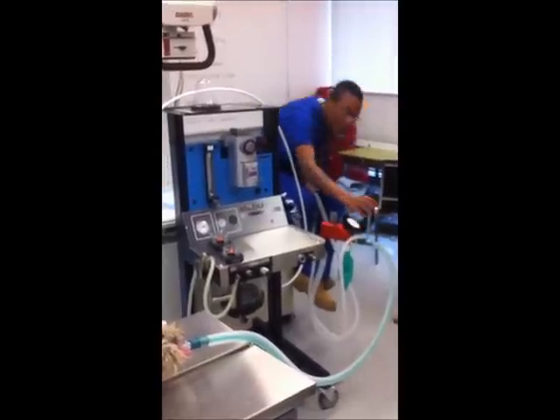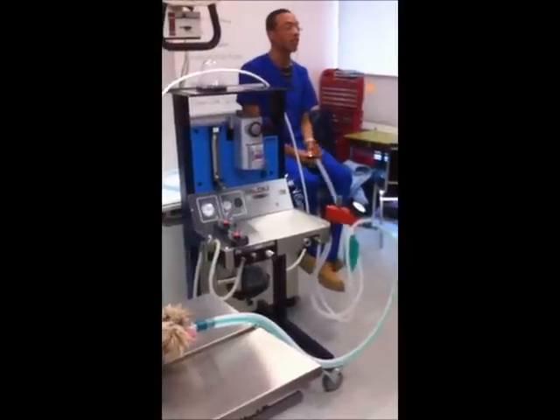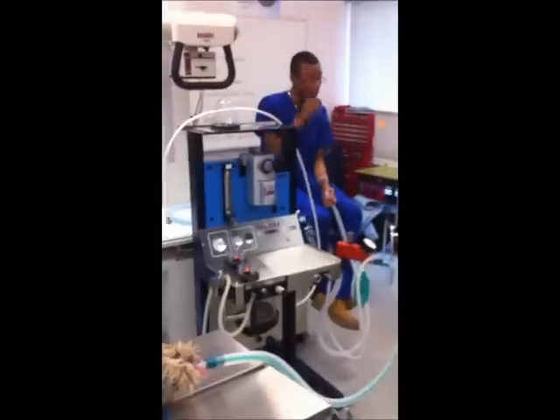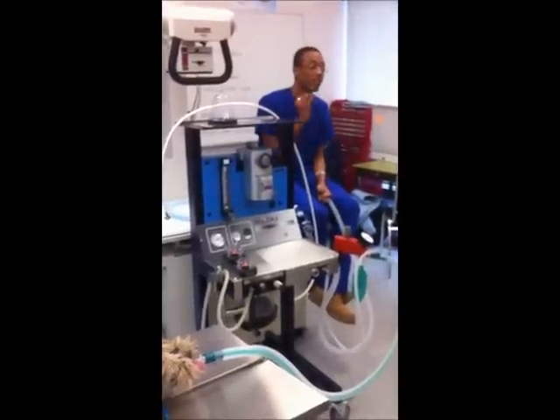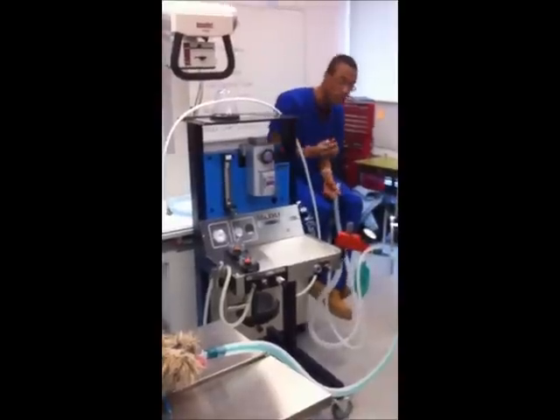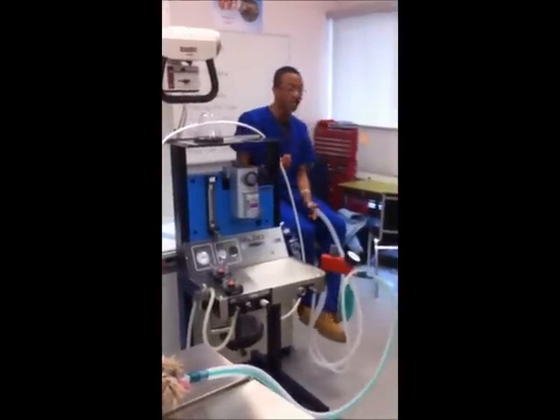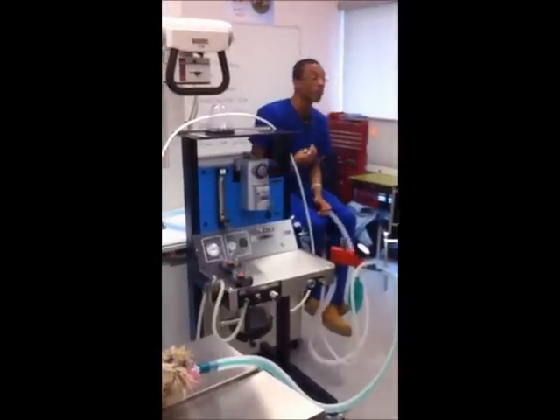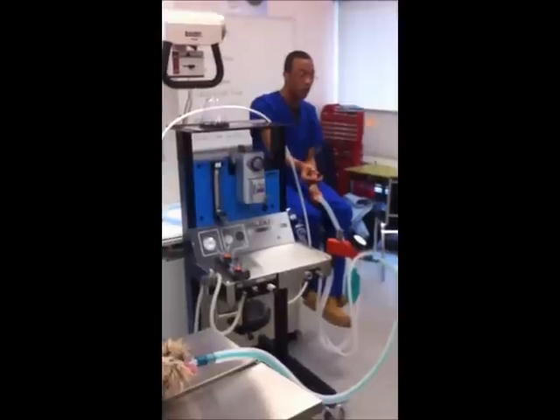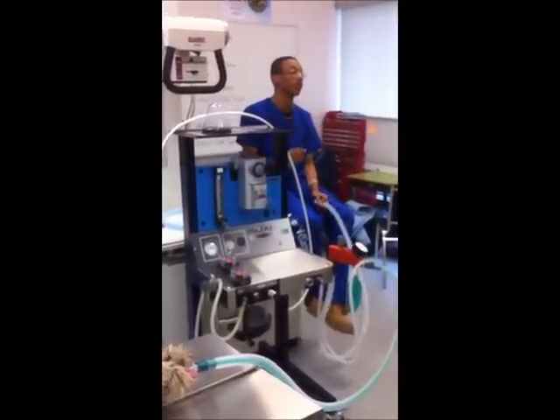Okay, so we're going to run through the flow again, starting from the fresh gas inlet. What is the next stop for your fresh gas? Through the inhalation tube. And that is one of the differences in the flow in the anesthetic machine between the non-rebreathing and the rebreathing system. In the rebreathing system, from your fresh gas inlet port, some of it will go to your rebreathing bag. In the non-rebreathing system, it does not go to your rebreathing bag. It goes to your inhalation hose.